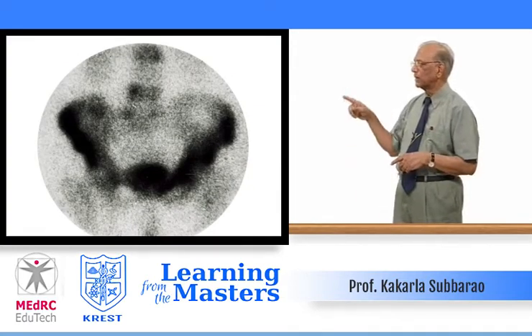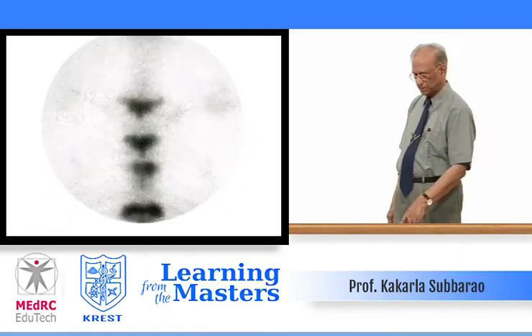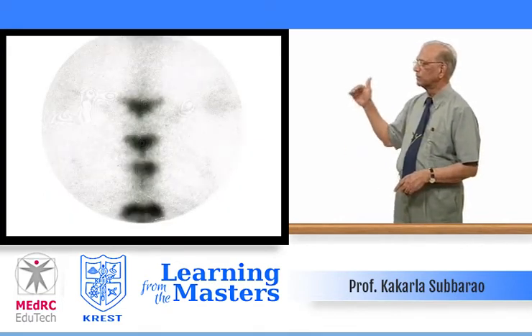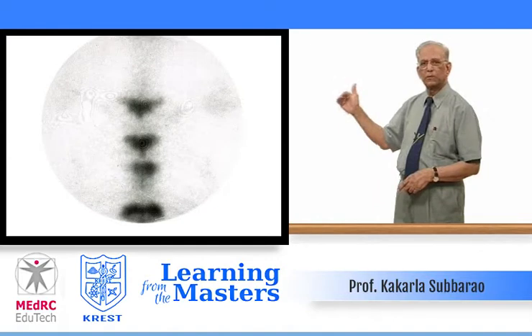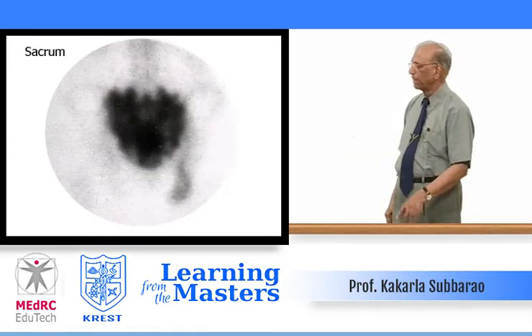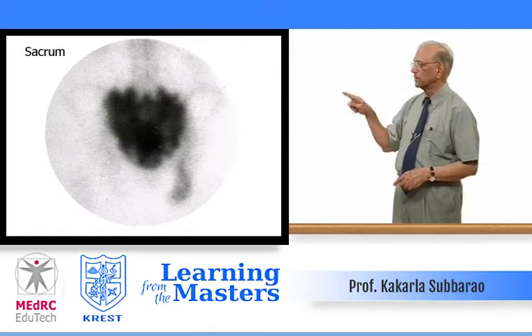Again, you see the bladder and multiple vertebrae as well as the iliac bones that are involved in Paget disease. Multiple vertebrae from the thoracic, T1, T4, T6, T10, like that, multiple vertebrae in a step pattern are involved. Entire sacrum, you can outline the sacral margin.